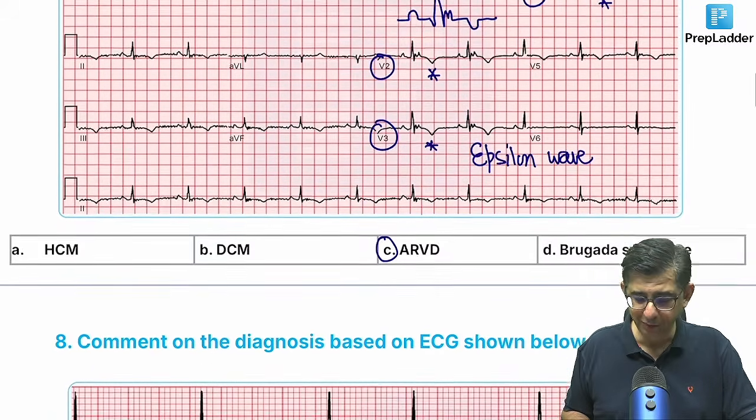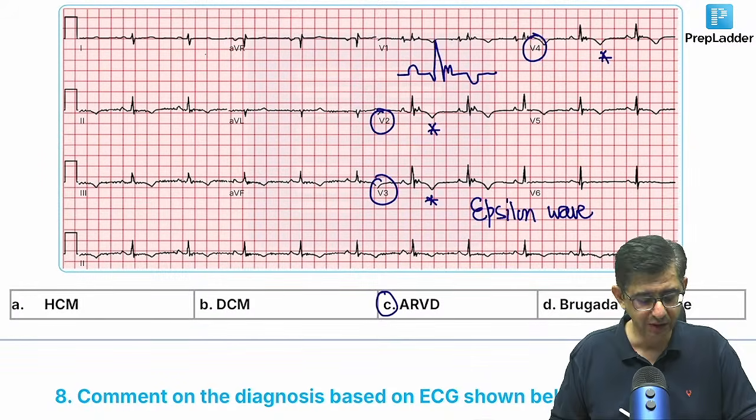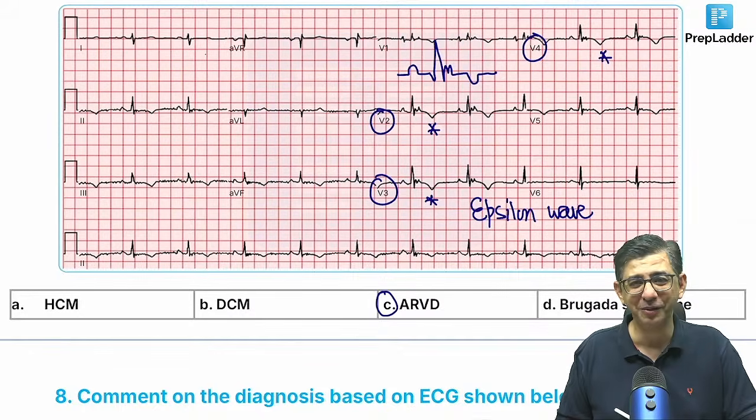What will be the treatment advice for this patient, considering that this patient survives? Like this person has Osborne wave will come up, bache. Bashishta Day, the Osborne wave will come up today. So just be patient another 10 minutes and you will get it.